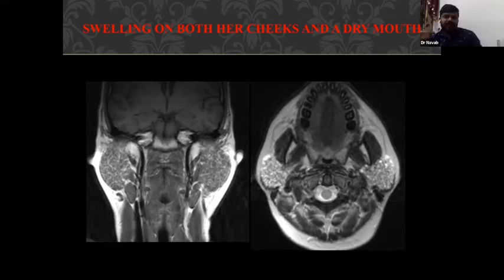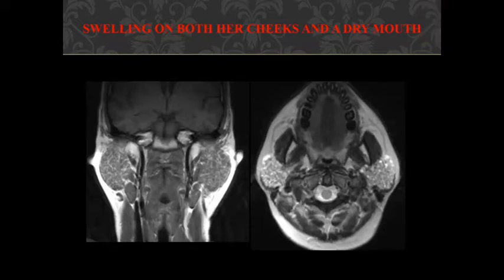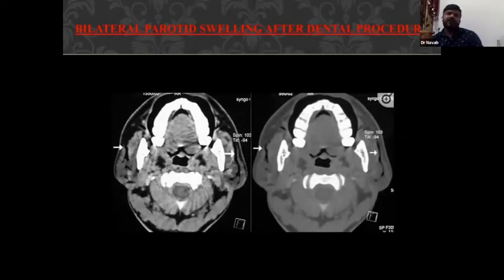What is that actually? Lymphoid aggregates? No, actually that is terminal dilated branch ducts. Okay. So sir, this is a case of Sjogren's syndrome. Okay. Next case.